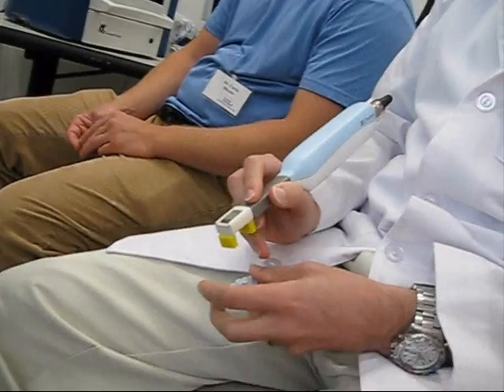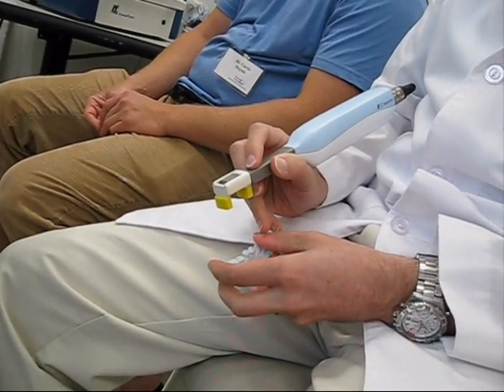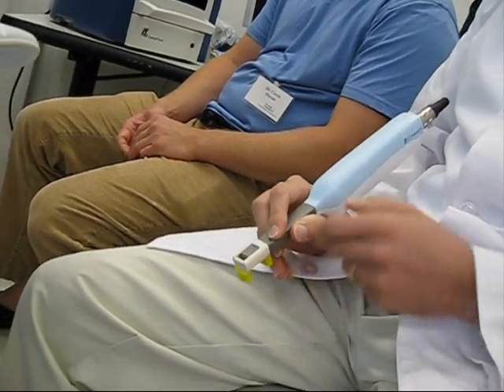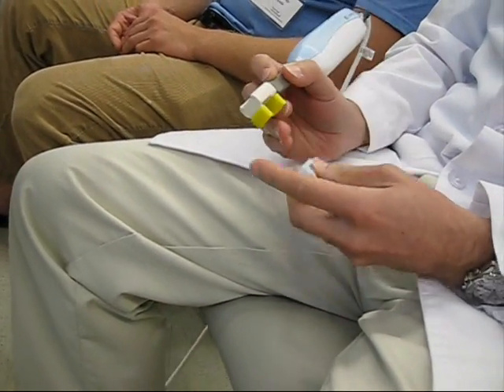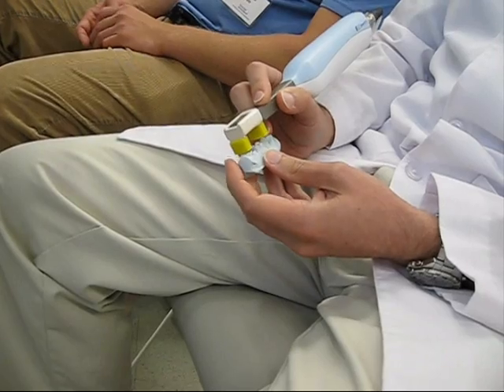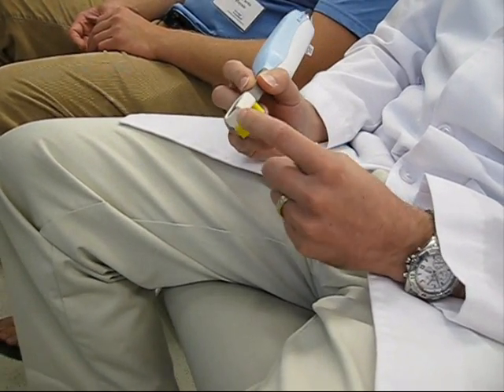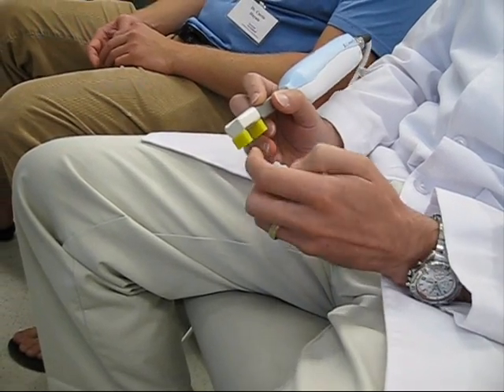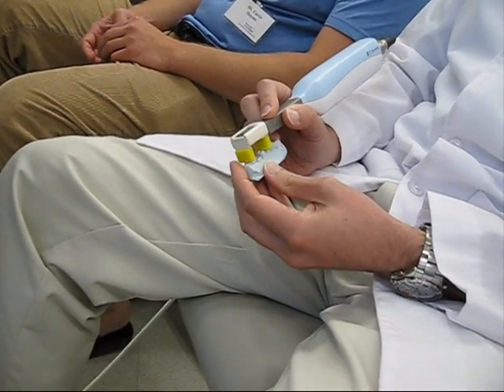Are those yellow stabilizers really necessary? See, there's a red scan. It'll automatically throw that out. The yellow feet are necessary. Company advocates different heights for different scans. Okay. So the yellow are a certain dimension, and they recommend you use those.